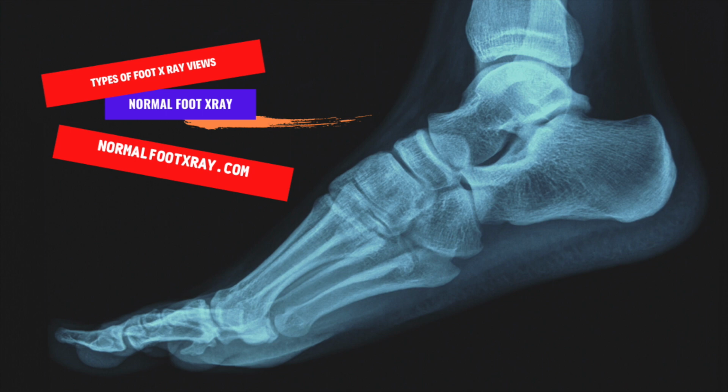Typically, a person should stand up with an extended leg. A lateral view shows the entire foot, and should show both sides of the ankle. Both the metatarsophalangeal joints and the fifth metatarsal are clear.